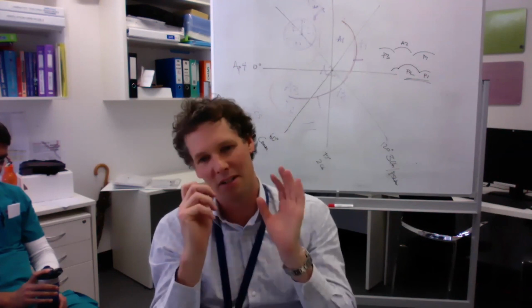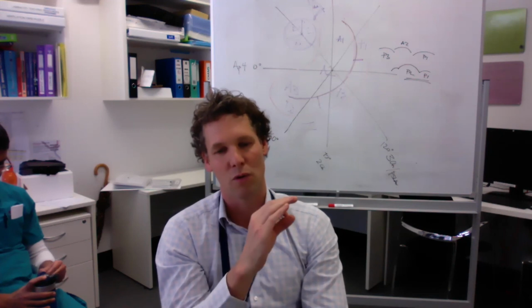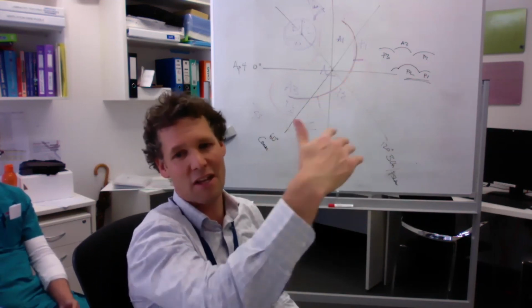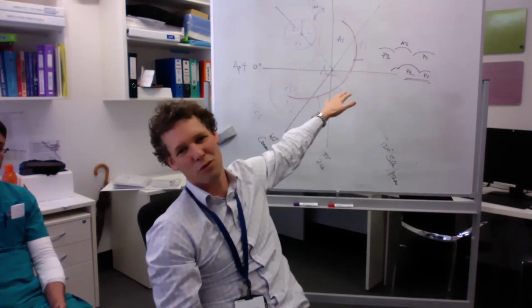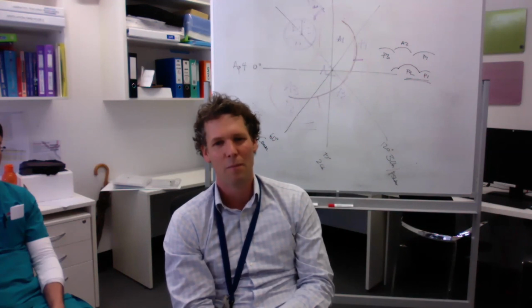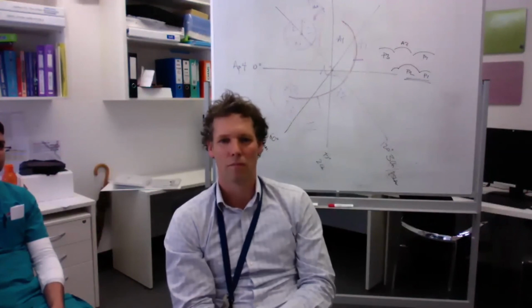I understand your point, but I'd love to put it in the exam because it separates those who know what they're talking about from those who don't. You don't have to be perfect, but you've got to understand a little bit. Tell me with certainty that's an anterior leaflet, that's a posterior leaflet. I sort of know that it's in the A2 region in the apical 4. I may not feel 100% confident, and I'm, of course, going to ask my colleagues for their help on this one. Does that make sense? I hear what you're saying. I'm glad to hear that it's not pass-fail, it's additional bonus marks. Yeah. That's really all I want to hear.